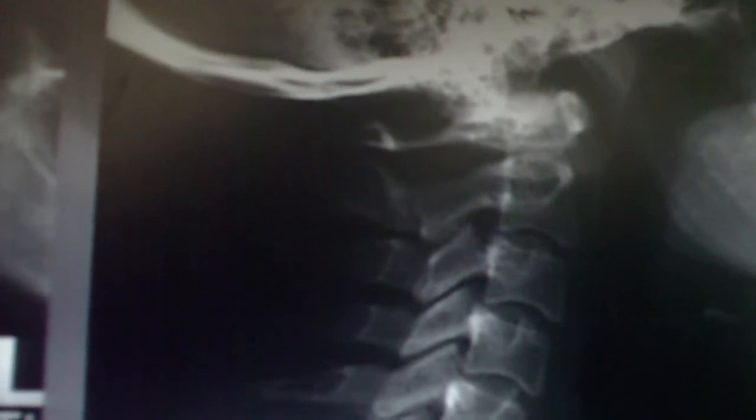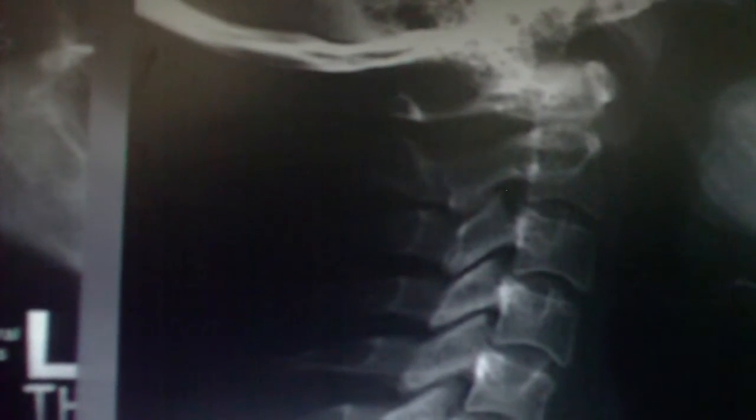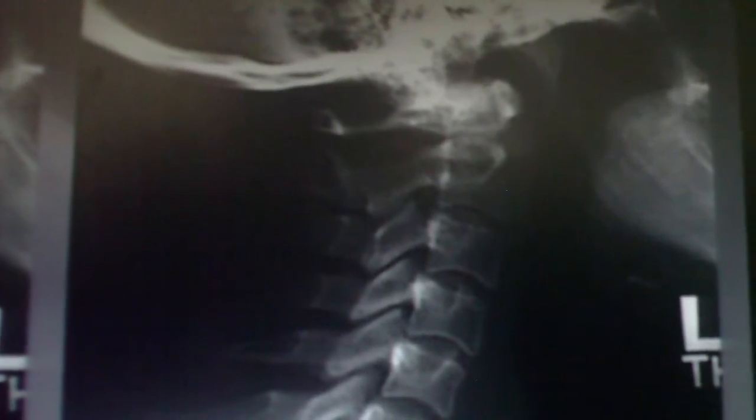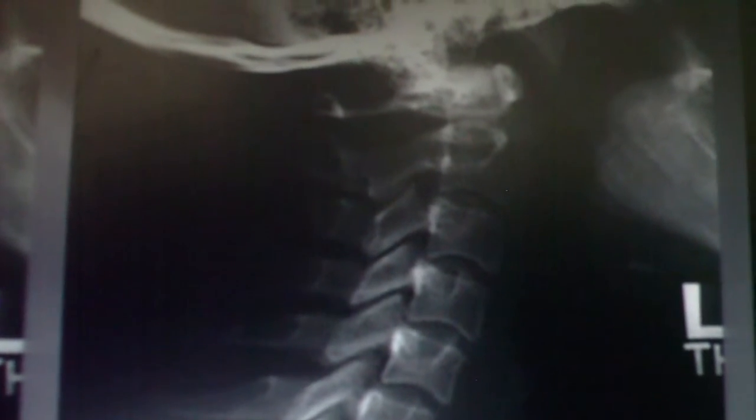Okay, so if you've got a cleft in the front and the back, right? Anterior tubercle and posterior tubercle, then you've got two parts then to your atlas, so it's called a bipartite atlas, right? And think about it, you know, if a person would take a dive maybe into a shallow pool or something like that, because it's cartilage, it could be similar to a Jefferson fracture, and you get it separating out, right? It's possible. So it's an area that you need to be concerned about with treatment.